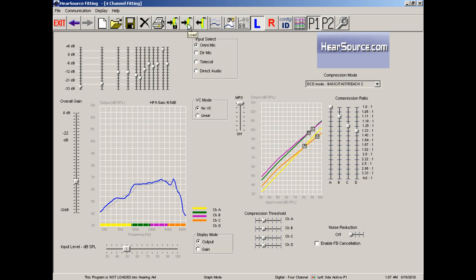Now it's important to remember that when you load something, you're only setting the information in the temporary memory. And so if you were to disconnect power after just loading the information, you would actually lose all that data. So to make things permanent, you have to follow your load by clicking the lock button, and this moves that information from the temporary memory into the permanent memory.